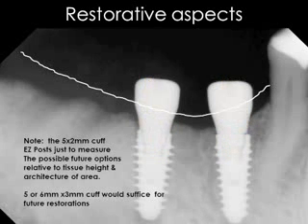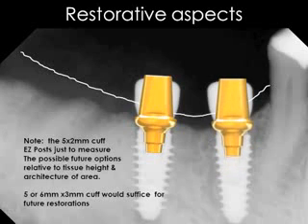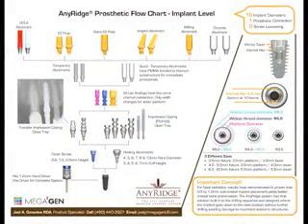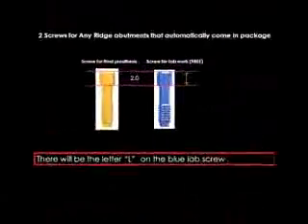Note the different prosthetic options that you see. Just as a little measuring device, you can see there was a 5 flare. Now that's a 6 flare to note the different emergence profiles you can deal with. Here you see all the different abutment options that are available: easy post, X-ray easy post, angled abutment, milling abutment, zirconia abutments. One prosthetic table. We do have your PMMA temporary abutments that are very nicely utilizable for immediate prosthetics.